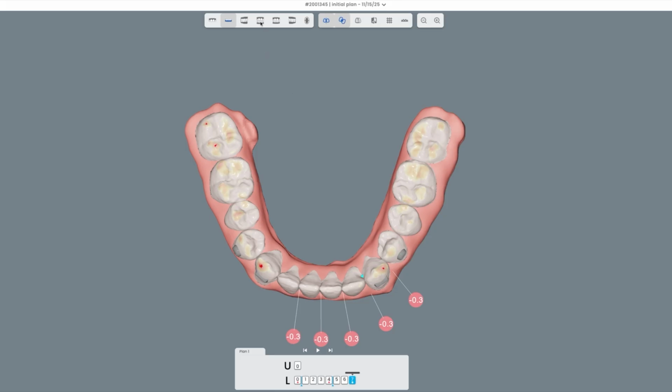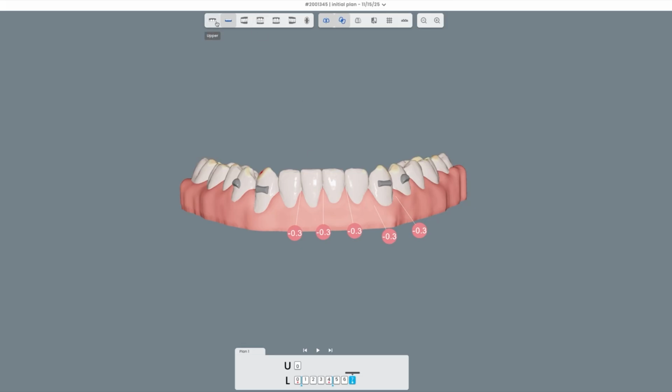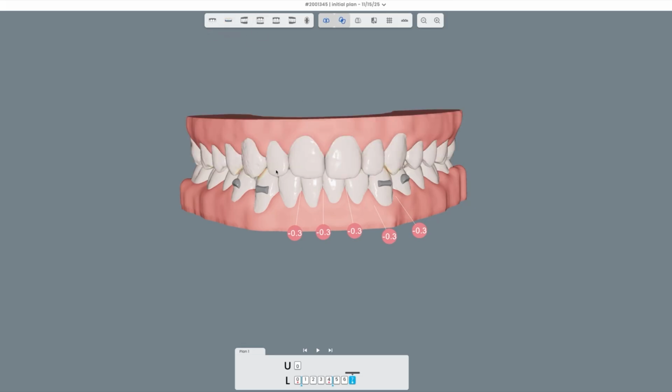I typically look from the front like we talked about before, kind of just see how things look. We look at the smile line again, and I'm not so much concerned about this. Mandibular teeth, typically, we're not as concerned so much with the smile line as more of occlusion. Usually the maxillary anterior teeth is kind of the sweet spot for that smile line in there, and it's really not affected in this area. Also look at the attachments, make sure there's no interferences with attachments.